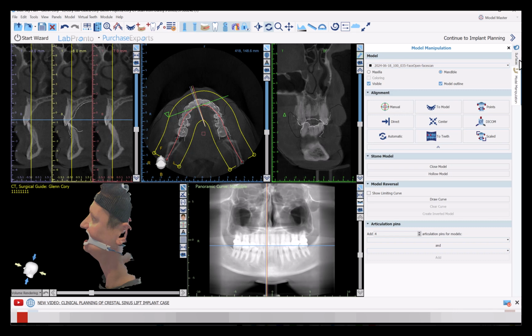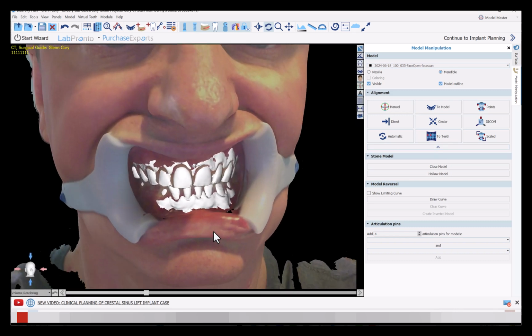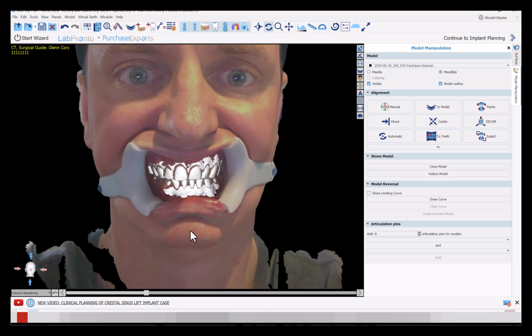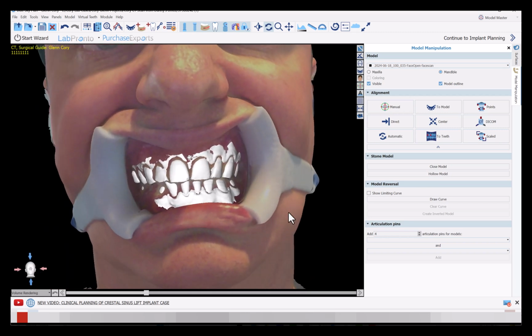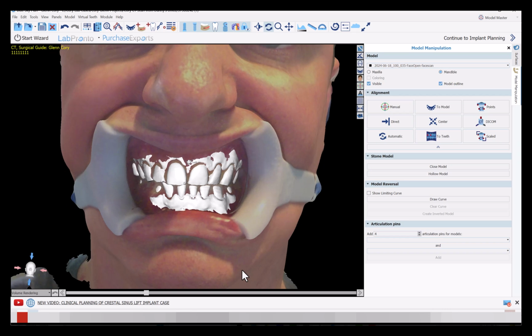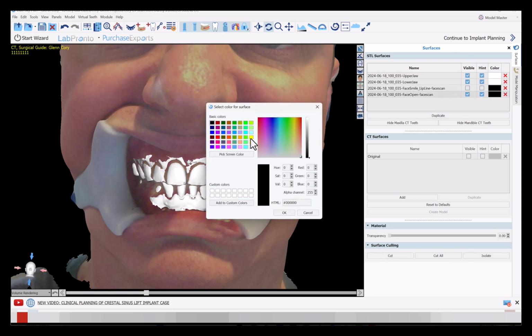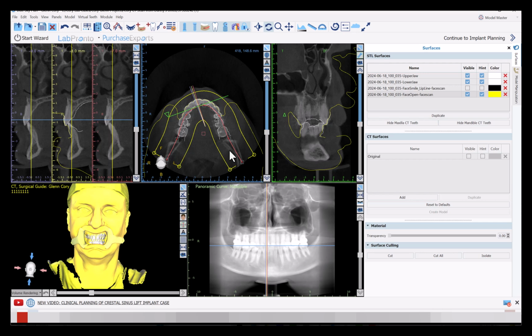Again, how can I be confident though? You know, in this program, I don't have a heat map that shows it. So I've got to essentially verify that manually. So I'm looking there. Is it close? Yeah, it's close. It's not necessarily dead on. And the only way I know of to verify whether or not it is to now change your model outline on the face to something other than that black color and start verifying it in your various windows.